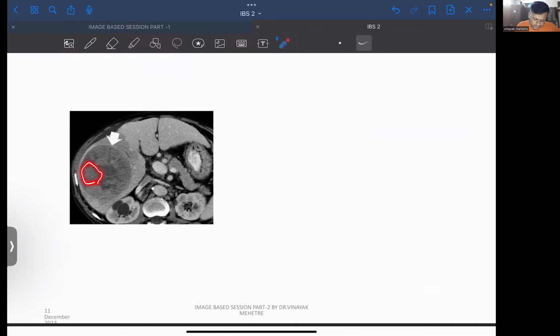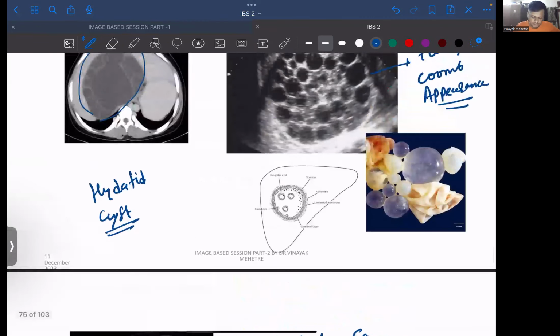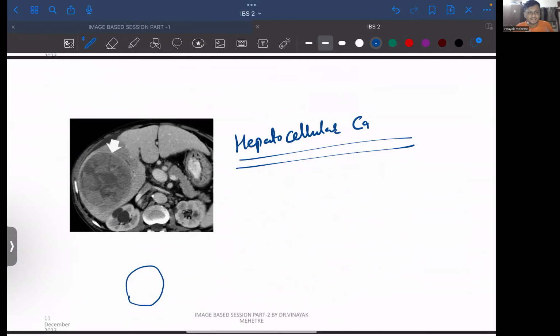not able to appreciate clearly, है ना, it is always going to be hepatocellular carcinoma, कैंसर है. ओके, एब्सेस है किसी और तरह का, तो you will see a blackish clear shadow. Hydatid cyst, white line will be clear. हेपेटोसेलुलर कार्सिनोमा में व्हाइट ब्लैक मिक्स होगा, नो डिफाइंड बॉर्डर्स, राइट. ये होता है.